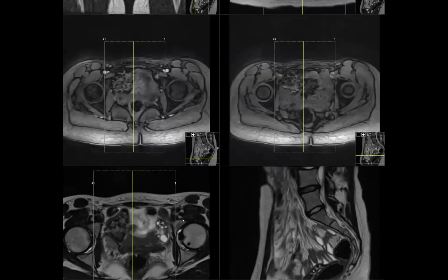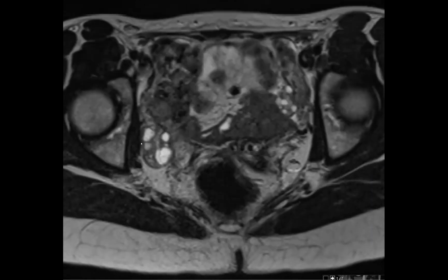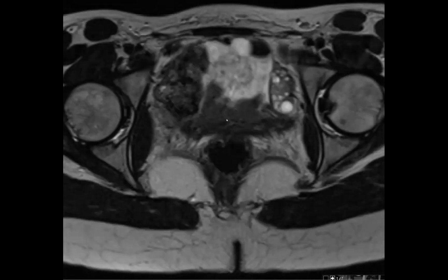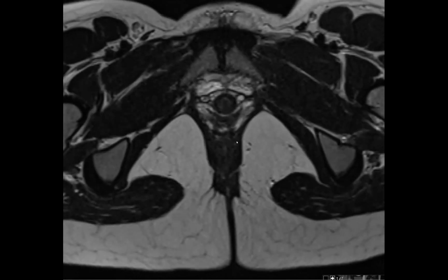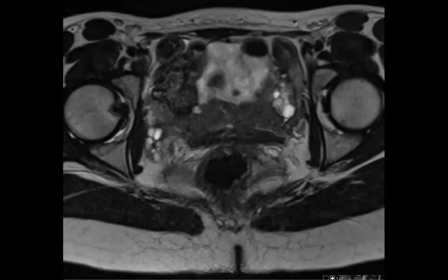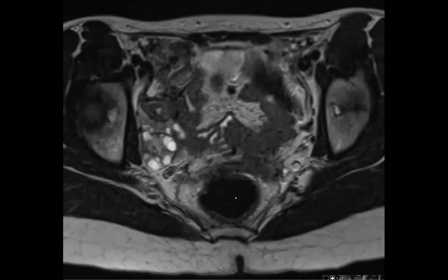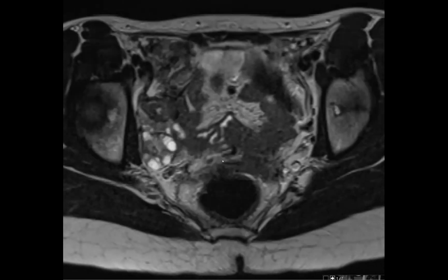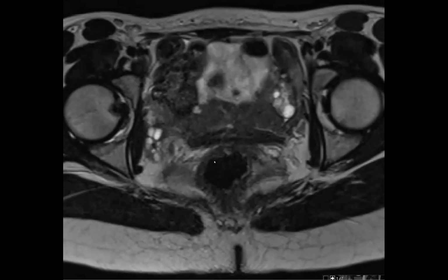And then if I go to the axial, we can see this is the right ovary, this is the left ovary. Scrolling down, there's the urethra, the vagina, which then disappears. We have no uterus. And of course, there's an eponym. What are the kidneys like? We don't have the kidneys here, but that's a good thought, because if you have a uterine abnormality, you frequently have renal agenesis.